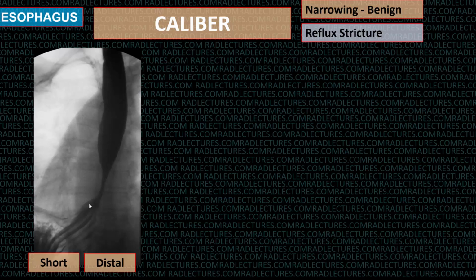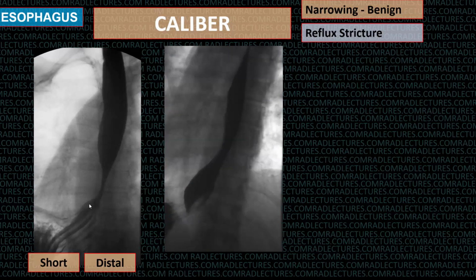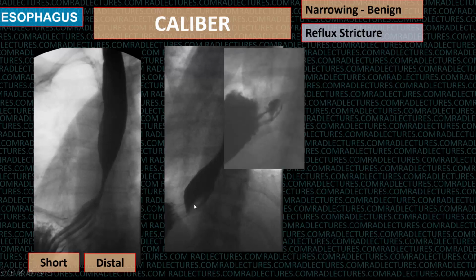Apart from strictures, the reflux can also cause reflux esophagitis, and one of the typical appearances of that is a presence of a small polyp or thickened fold, which is called a sentinel fold. Here and also here. Here you can also see some ulceration. When you see that, that means that this is typical of reflux esophagitis. The reason you should be able to recognize that is, if you see that on a barium study, then that means you need to look for reflux more carefully than usual.